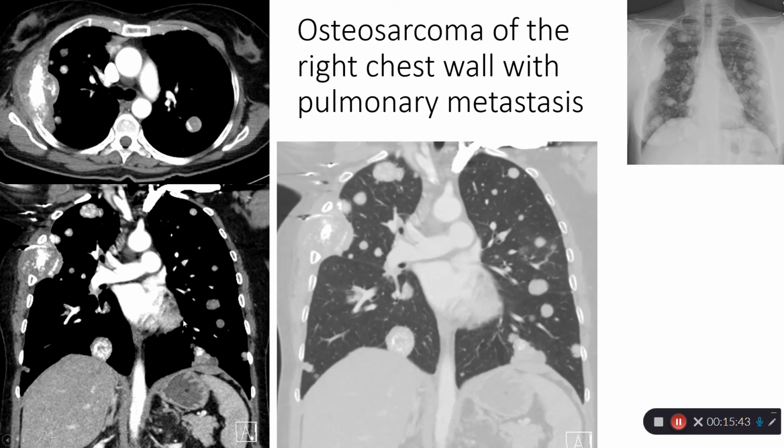And I just wanted to show this case as an example. We commonly see calcified nodules in the lungs. However, there are some malignancies which will demonstrate calcification, osteosarcoma being one, as you know, given that it's from the bone, it actually has osteoid matrix associated with it that gives you this calcification we can see here.